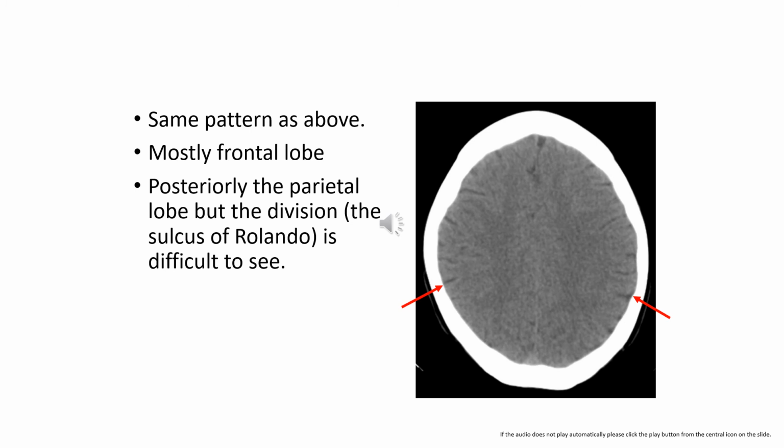This can be difficult to define structurally, but remember this is the region that is relatively protected in intrinsic neurodegenerative dementia, and therefore this is a region of maintenance of grey matter FDG uptake in the intrinsic neurodegenerative dementias of Alzheimer's disease, frontotemporal dementia, and Lewy body dementia. But again, it's relatively posterior in these axial images.